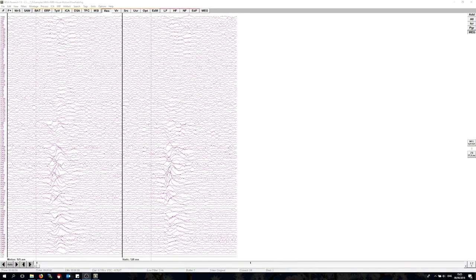This video will demonstrate the use of brain atlases in BESA Research. We will have a look at brain activity evoked by a visual motion field in an MEG experiment. We have the average data available here, and have co-registered the dataset with an individual structural MRI of the subject.